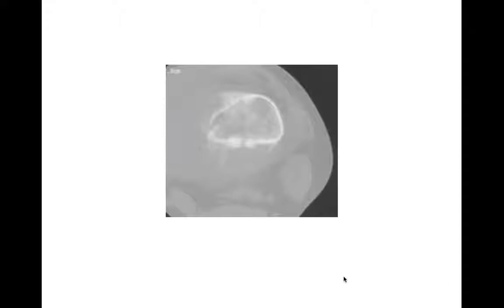This is an axial CT scan through an osteosarcoma showing us a Codman's triangle periosteal reaction right here. Here's the periosteum lifted up off the bone. It's kind of filling in with some sclerosis here, and you get a sense there's probably some hair on end periosteal reaction here. Again, not so important that you describe it perfectly as the type of periosteal reaction, as long as you recognize that this is an aggressive periosteal reaction. So you can think of aggressive tumors or aggressive lesions causing this. In this case, again, osteosarcoma.